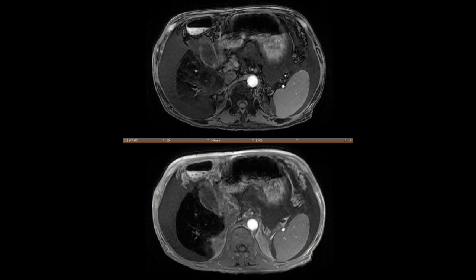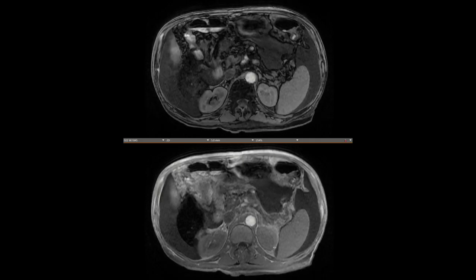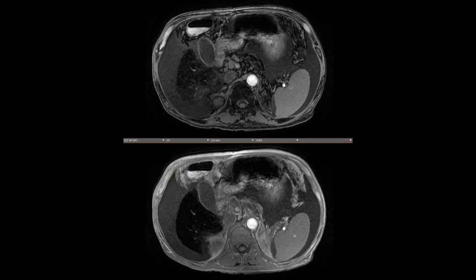The pancreas is usually spared. And so the way that I think about it is P is primary, but is also pancreas. And so here you can see the pancreas involved. S is secondary, and the S for spleen is also involved. So this is a nice example of primary hemochromatosis that you can see with the iron deposition within the liver and the pancreas.